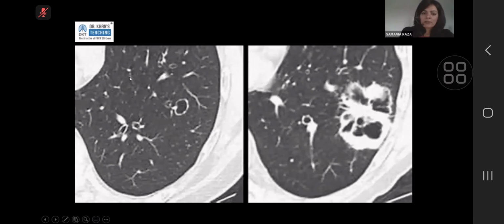Just the same lesion, looking back at it, you can see that this was actually just a small lung cyst that evolved into that. That just shows you the importance of follow-up over time. So it's very important to put things into perspective when we look back and imagine if you were looking at only that scan, would we have followed it up differently?